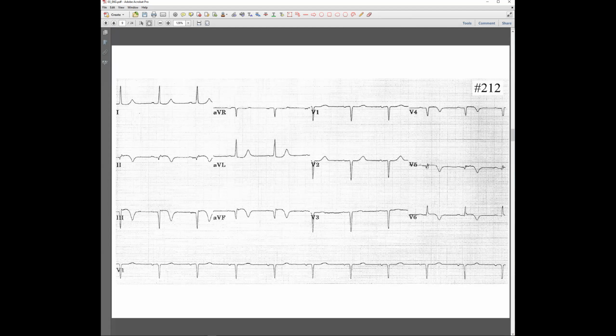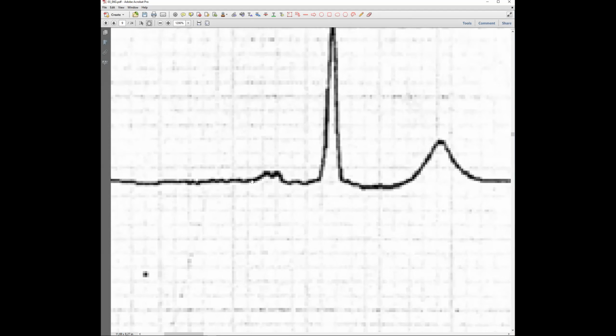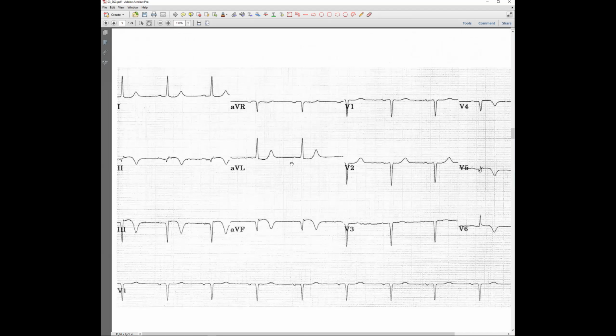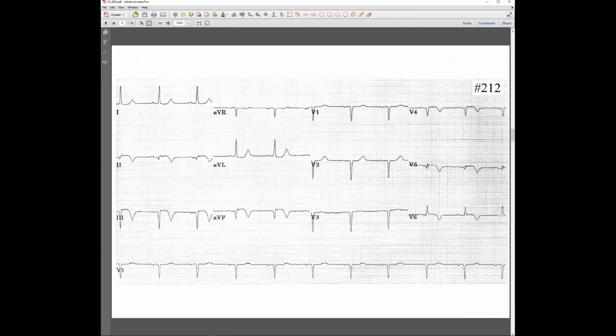All right. Sorry, another question about this one. So you mentioned that the left atrium hypertrophy was told through the notched P wave. Yes. All right. So okay, thank you. Okay. The next one.